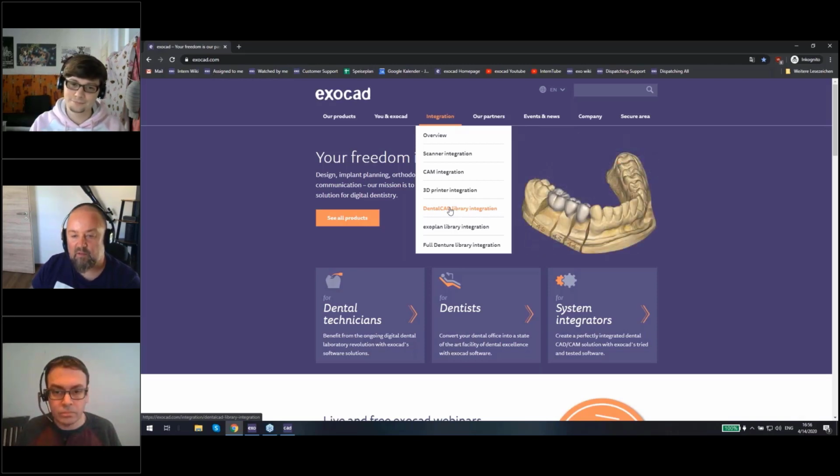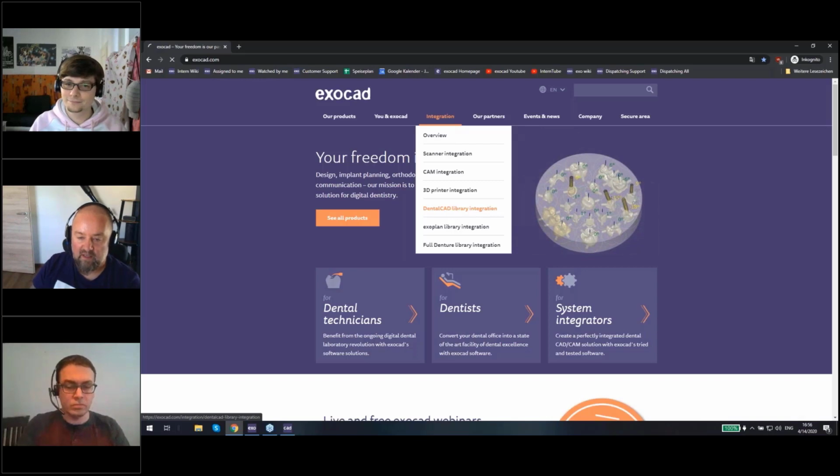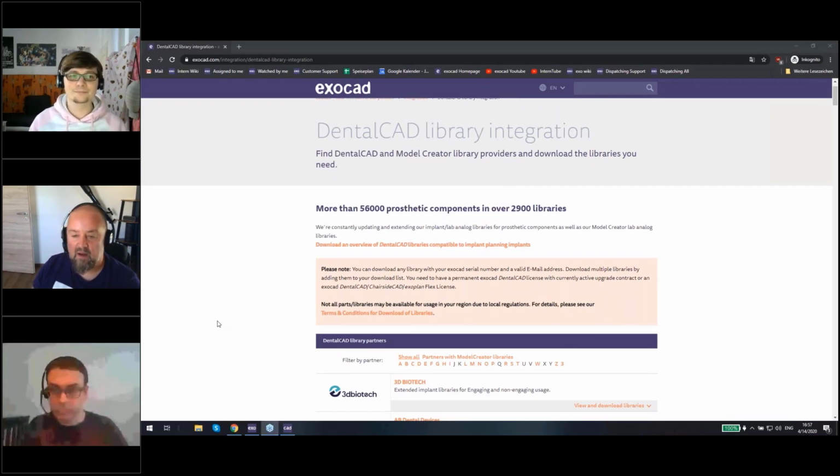I would also not recommend asking a friend who has a newer version to get a new tools library, for example from Plovdiv, and to install this into Matera. This could lead to problems in your software while designing, because we are always improving the libraries and the software together. For example, there might be new features in the library which will be used in different steps in the software. So it could lead to problems to do that.